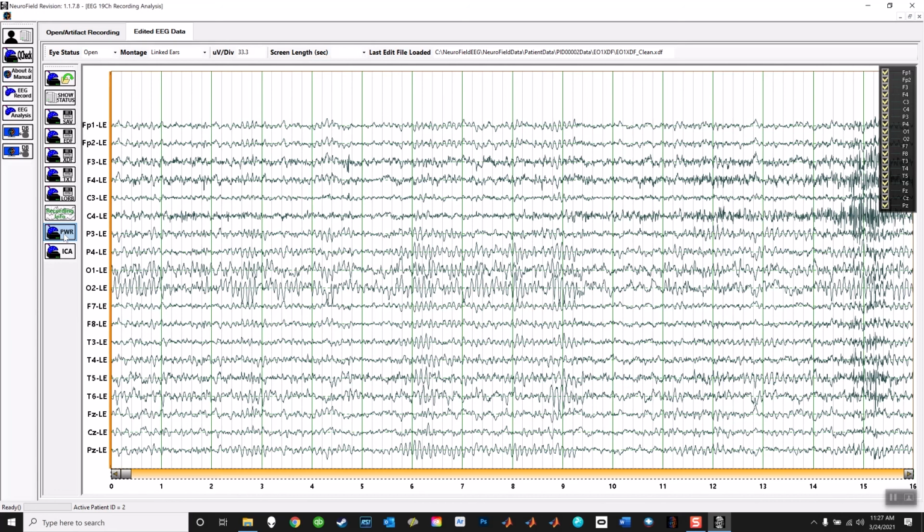Okay, so this is a brief tutorial of the EEG program. I know I hit you with a lot of information. There's a big universe awaiting you here in the EEG field. And when we analyze the most complex noise in the known universe, it's really exciting, but it's also daunting at the same time. There's a lot to learn.